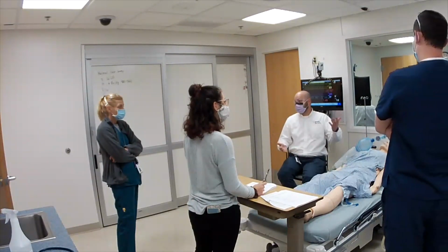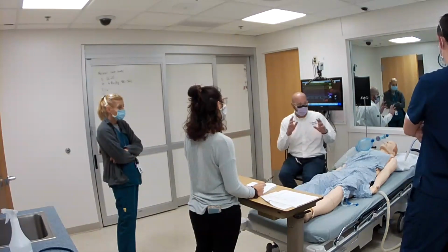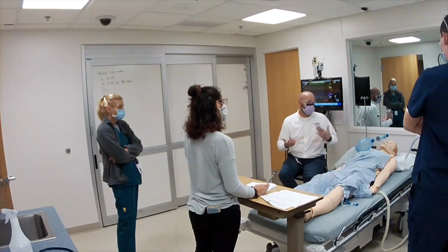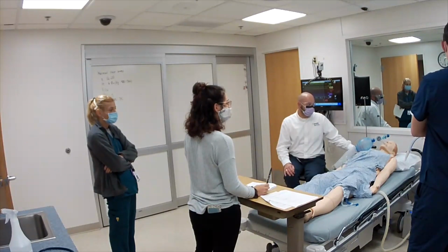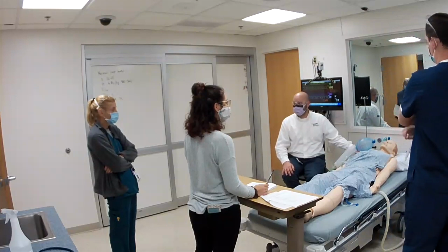I tend to like the trigger a little lower, especially in the transport patients. But if everything's equal and they're breathing on their own and they're pretty calm and settled in bed in the unit somewhere, then having it pretty close makes people a lot more comfortable. Okay. Everybody happy with those numbers?